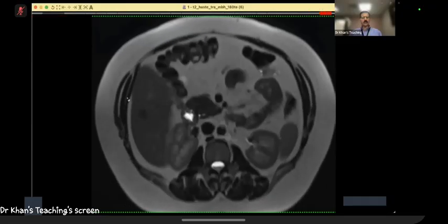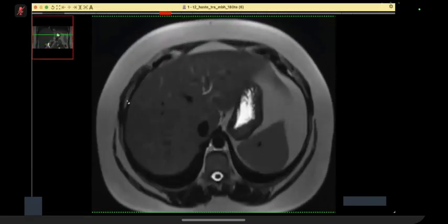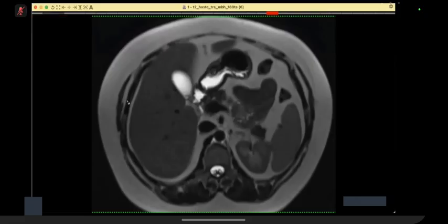So I'd like to see the enhancement of the scar, of this central hypo-intense signal. What is your differential diagnosis before that phase? What is your differential diagnosis? Differential diagnosis would include a flash filling hemangioma.